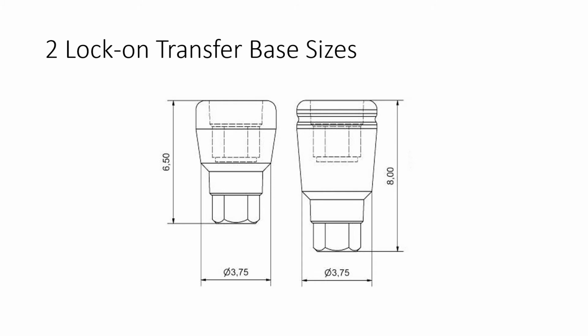Now, for those amongst you who are interested in sizes and dimensions, this diagram shows the height, and although the diameter of the transfer base can vary slightly, this plays no role in the actual fitting to our implants, and all these bases will fit on all diameters of implants.